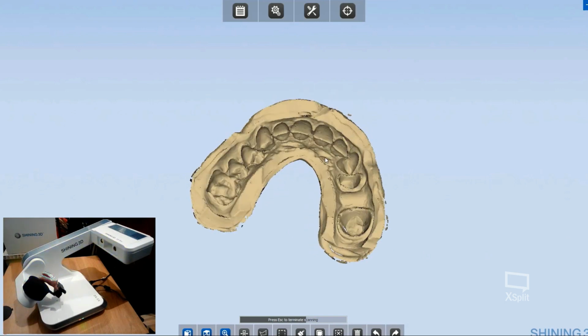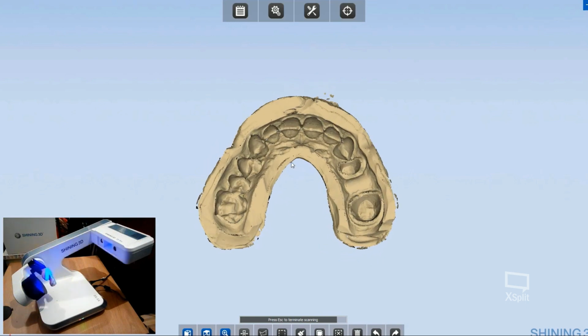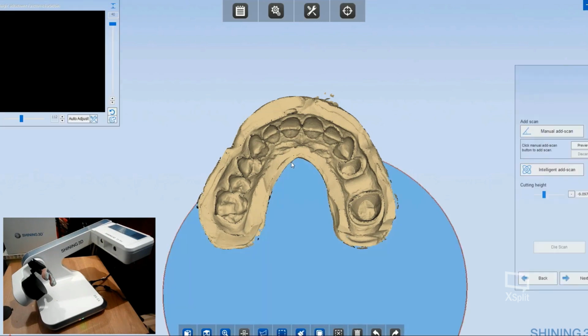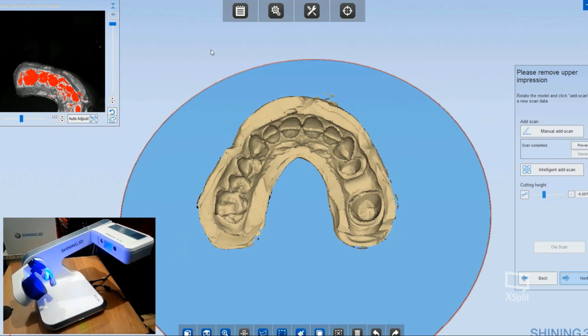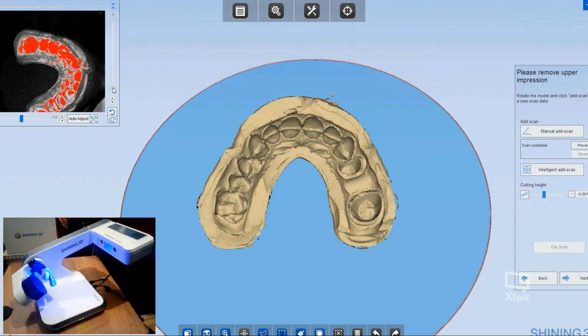The possibility to customize the cycles is really time-saving, because the cycle in this case depends on the geometry of your model. So if you need to add data, you can do it. If you don't need, you can go ahead without adding further acquisition.